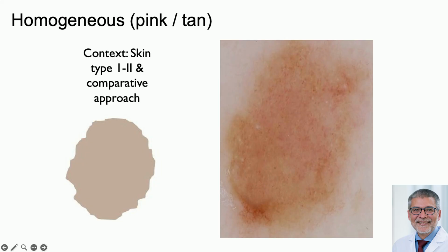And very different than if you have darker skin and you're seeing vessels in a lesion, that speaks in favor of neoangiogenesis. So in fair-skinned individuals who have these light nevi, in all of them, you will see vessels, all right? And these vessels will look a little weird. They'll look similar to the vessels that are described for amelanotic melanoma.